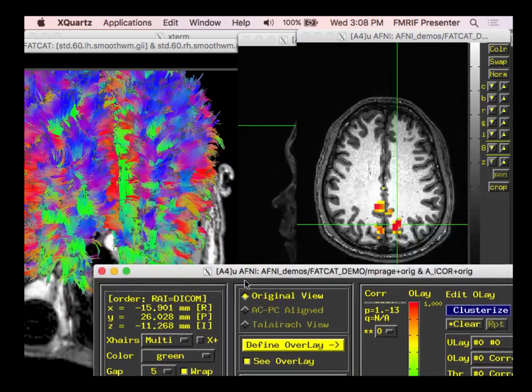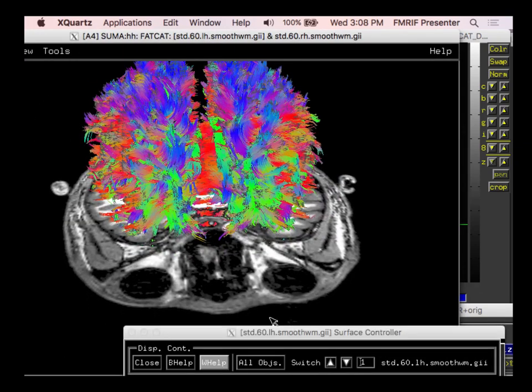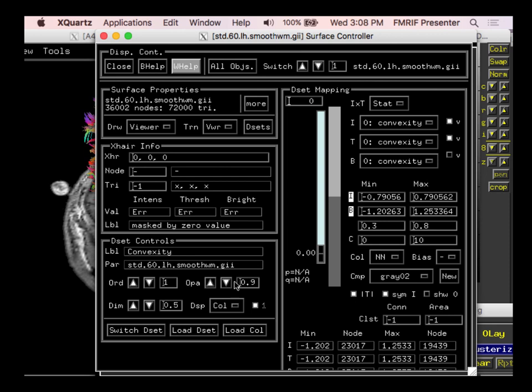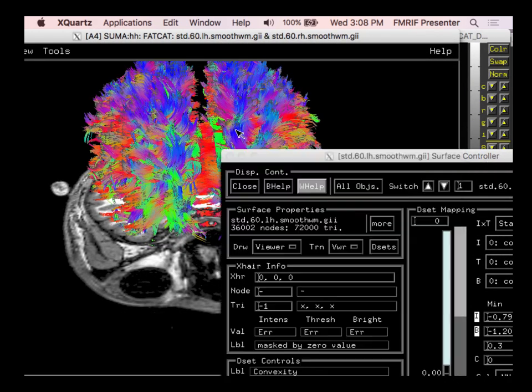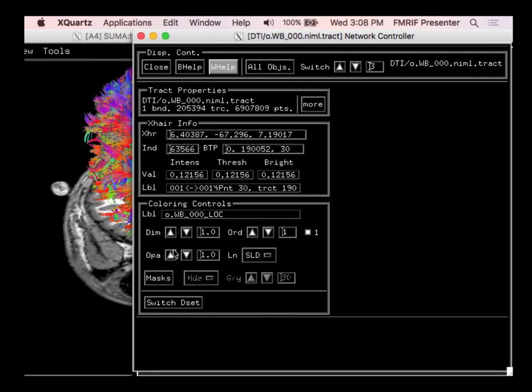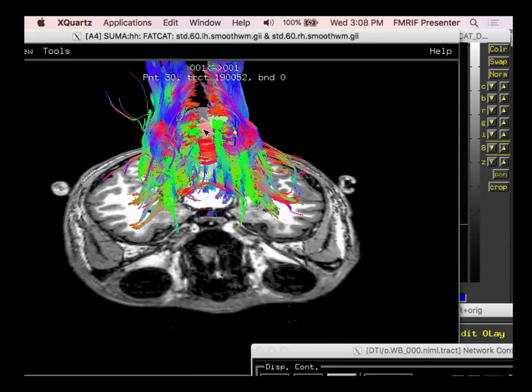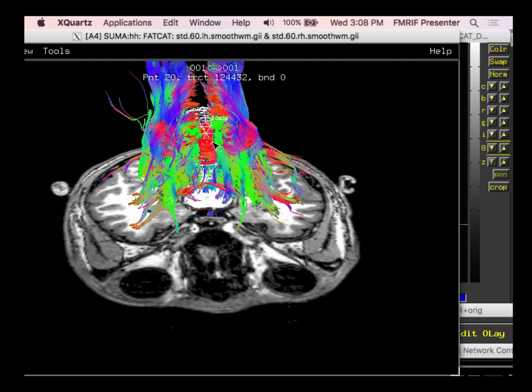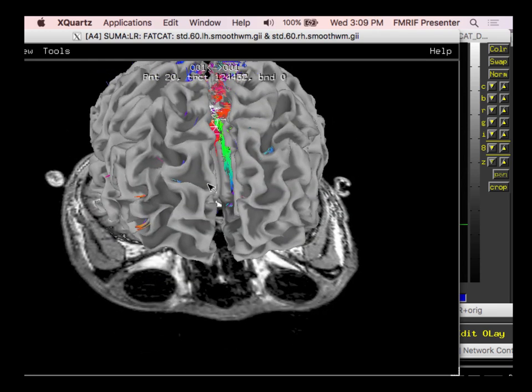Now, we were looking just before at something a little bit similar here, where we say I have a region and I might be interested in where there are structural connections through a region. So let me put a mask here. And I have my regions of the brain like this.